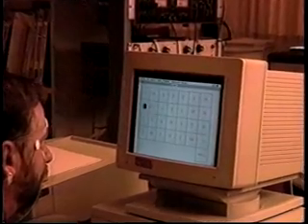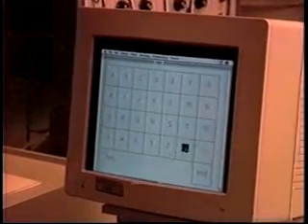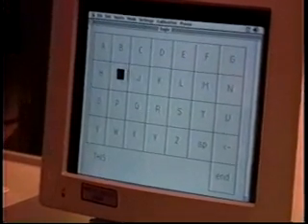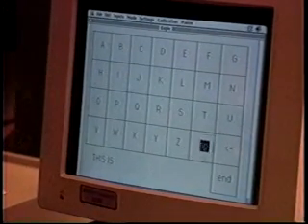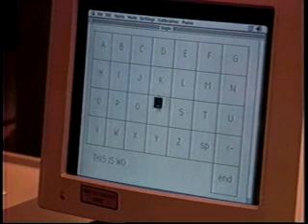The user is spelling out a message on the screen through the electrodes. A keyboard is displayed on the screen. The cursor is moved around the screen by the user by moving his eyes and head. If the user wants to select a letter, he looks at the letter.